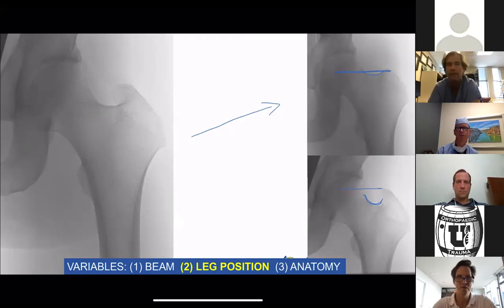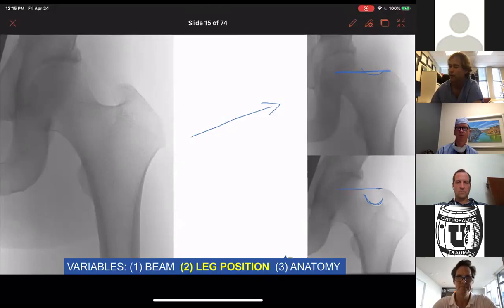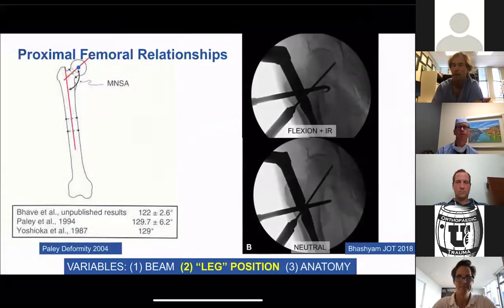We should be looking at different things, but we have to have an educated gestalt when we're going into it, because if all we have is the head neck segment and the shaft that is really moving for us, we need to know what those should look like compared to each other. All right. So you may look at this and say, well, crap, neither of those are reduced, so what does that matter? But this is an article that was published, and it's so complicated, I can't understand it. These guys are way smarter than I am, out of Harvard.